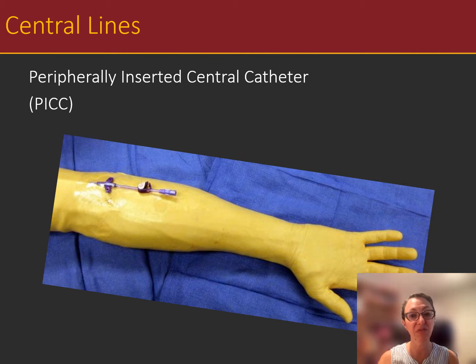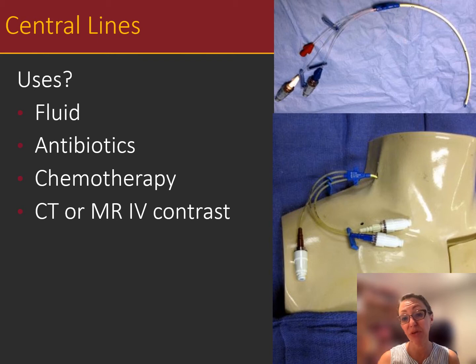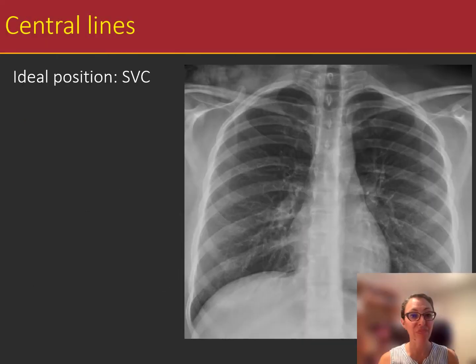Here's an example of one. And we also have the central lines. And what are they used for? Ideally, they're used for administration of fluids, antibiotics, chemotherapy agents, as well as CT or MRI contrast media. However, these could be irritating to the vessels.